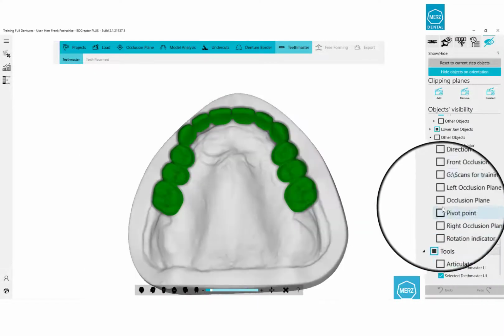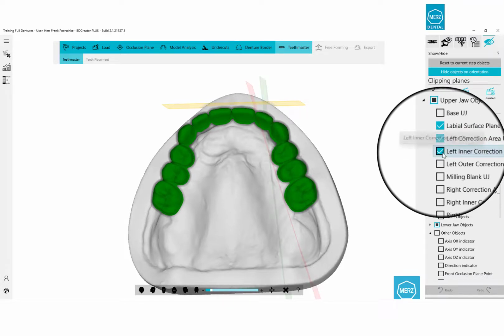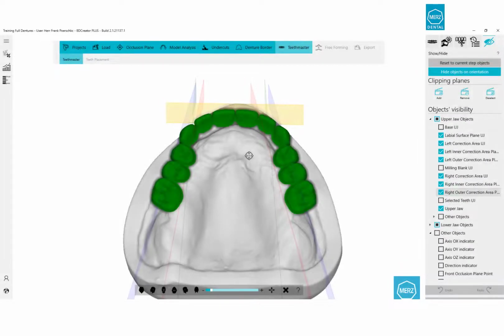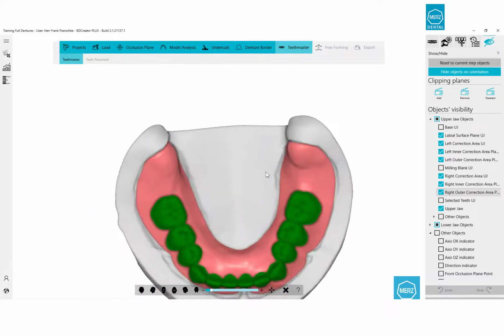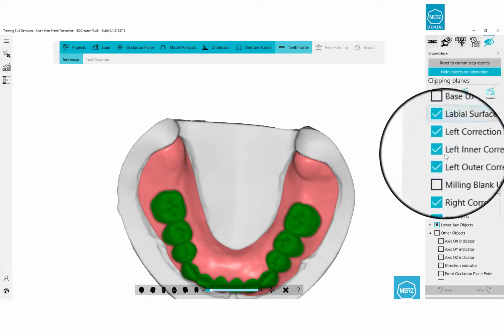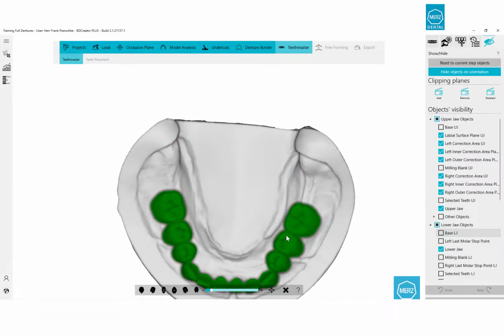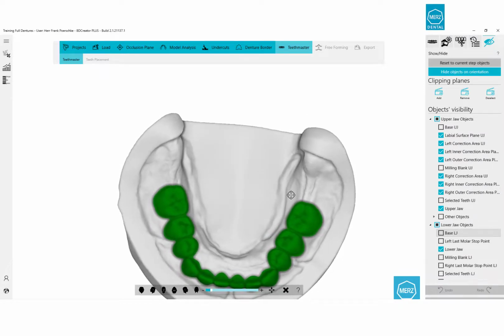The information from the model analysis can be displayed by using the show and hide functions. The user can thus assess the positioning of the teeth inside the defined field from the model analysis to verify the correct position of the posterior teeth. The positioning of the lower row of teeth should also be assessed. The posterior teeth should follow with the central fissure the highest crest of the alveolar ridge. Different variants of the constellations can be tried out and assessed in the results.